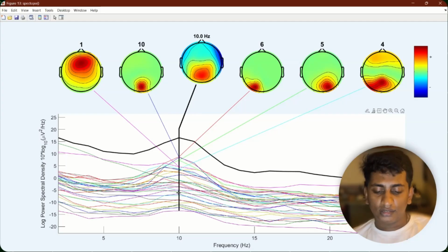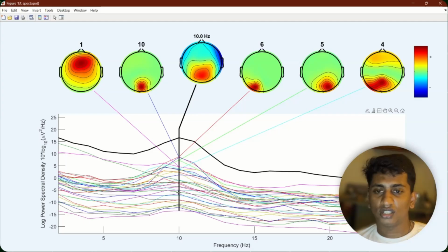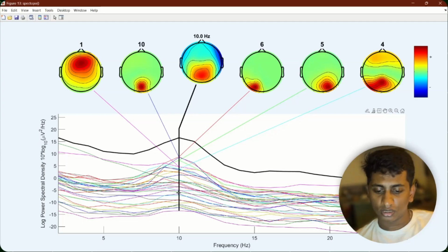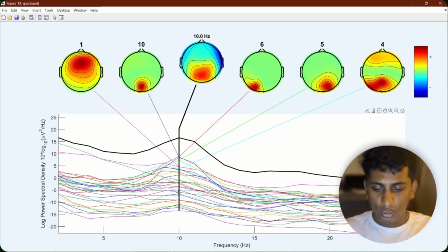If the number of channels is greater than 32 where memory is an issue, we'll set PCA to 32, which will reduce it to 32 dimensions only if necessary. The minimum data length rule of thumb is 20 times the number of channels squared. The convergence tolerance defaults as defined in EEGLAB. If convergence fails, it increases from 512 to 1024. So this is basically a component inspection criteria.